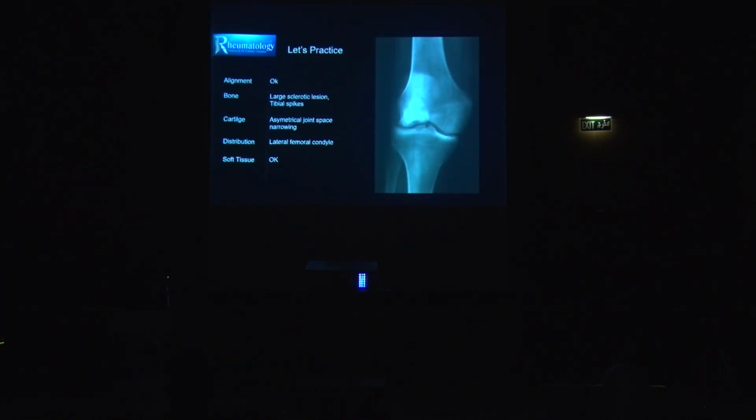Okay, so this image, what's striking here again is the abnormal texture. The texture is abnormal here. So you have a very dense kind of lesion here on this side of the femur, and this is osteonecrosis of the knee. Okay, so you have abnormal texture of the bone. This is an example of abnormal texture. Right? You see here, this is the normal texture, this is an abnormal texture.